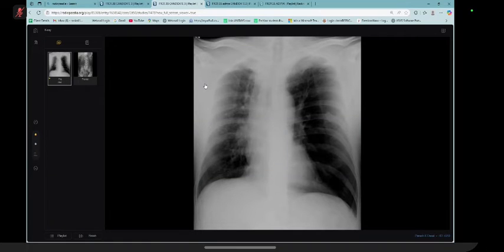Apart from that, you can say that in the chest there is a metastatic lesion with possibly a lung primary, or primary unknown, if you are not sure. The hilar is also very much prominent, and there is asymmetry, and the lung mets are also associated with pneumothorax.